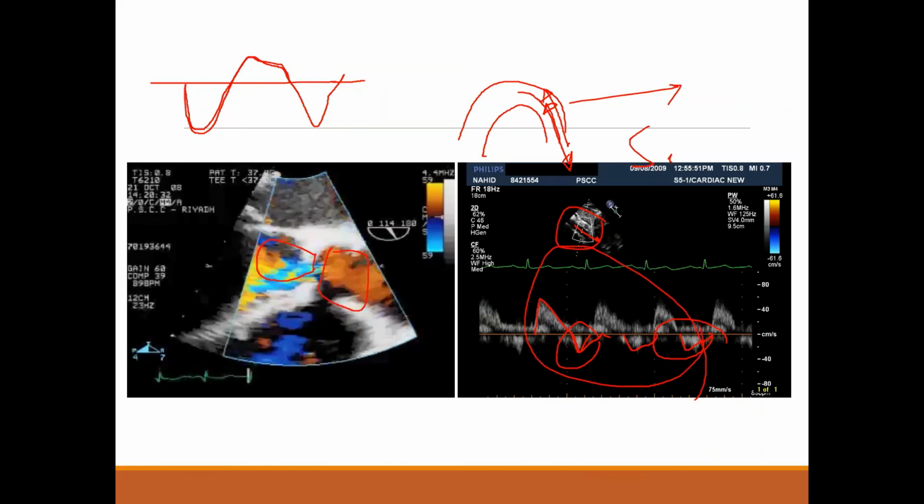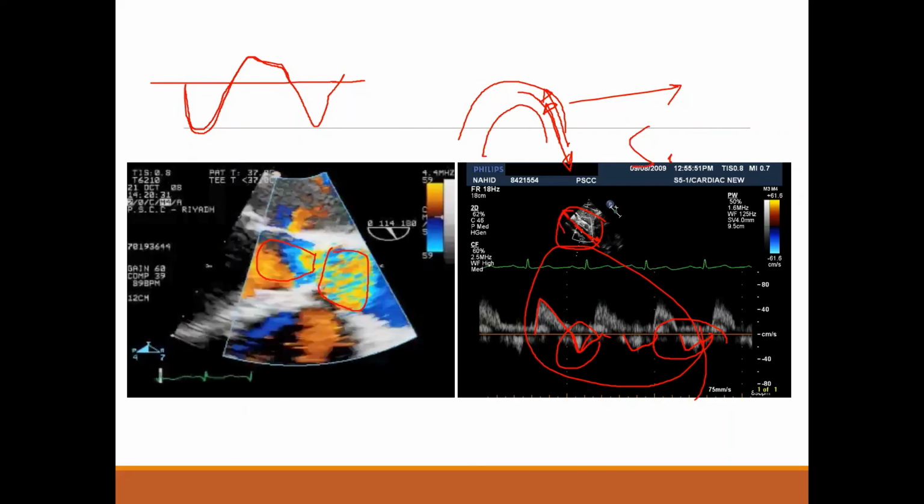Conversely, the abdominal aorta is exactly the opposite, because in the abdominal aorta the flow is forwards toward the probe. That's why it's above the baseline, and the reversal goes below the baseline. So remember this one. When it is pan-diastolic and you trace the TVI and it is more than 15, yes, that might be severe.